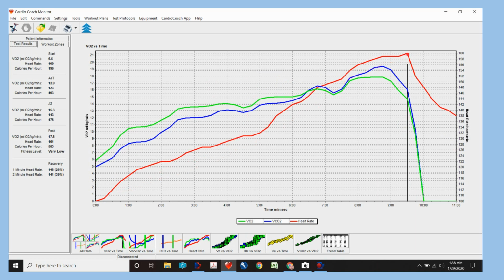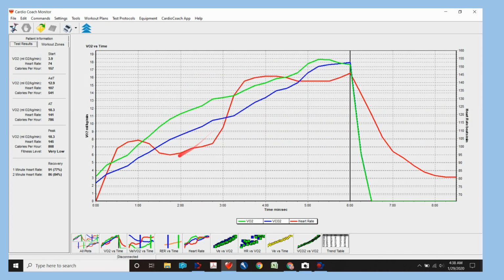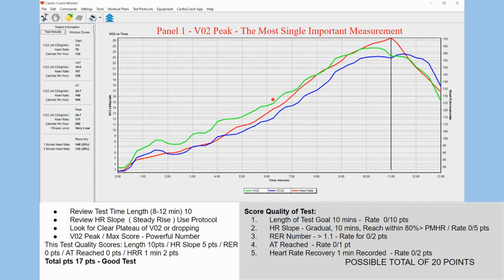This one, we could give it all 5 points, a nice gradient line. That one, we should just throw the test away. This one, the test is compromised. We might give it 1 point. This is what we're looking for right there.